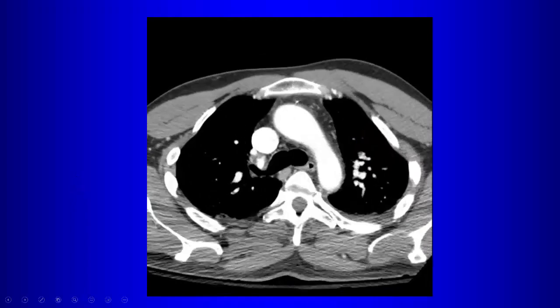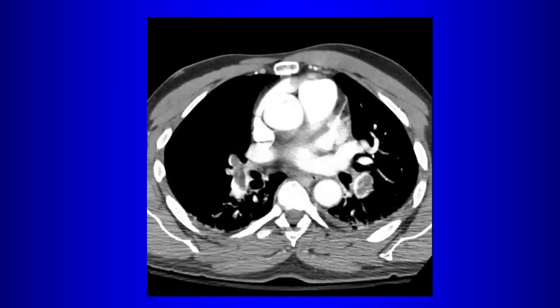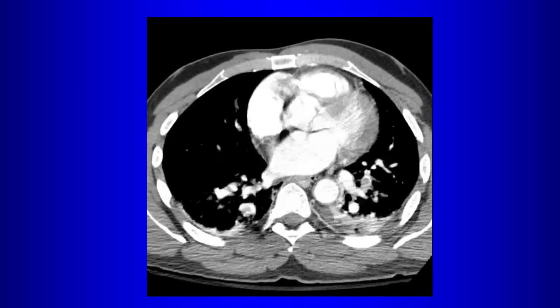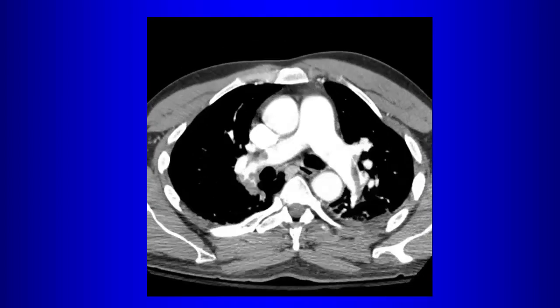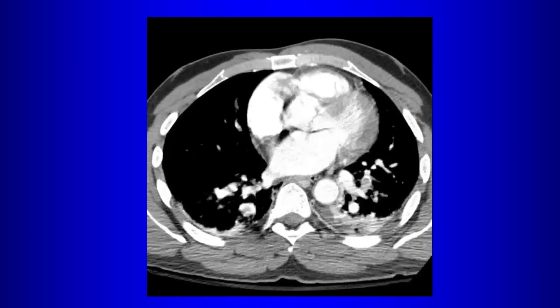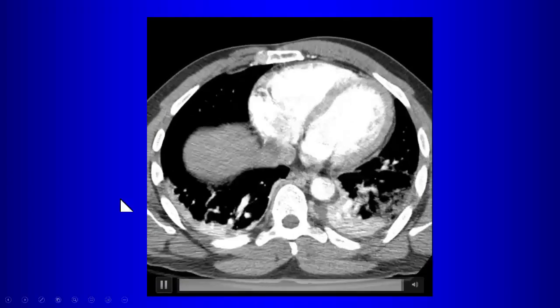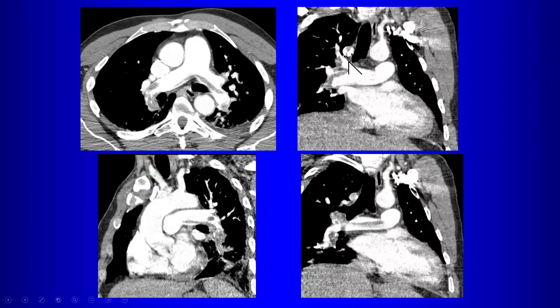So what happens is that these pulmonary emboli, these are casts of veins, usually from the lower extremity, lower portion of the body. So these are like strands of spaghetti or linguine that embolize to the lungs. So that's what we see. We see that string of clot going across the pulmonary bifurcation, and also additional filling defects extending down into the interlobars and segmental branches. Right? So there's your saddle embolism. You can see extension into the interlobar arteries and then down into the segmental branches of both lobes. And the reformatted views, of course, can increase your confidence whenever you're dealing with pulmonary embolism.